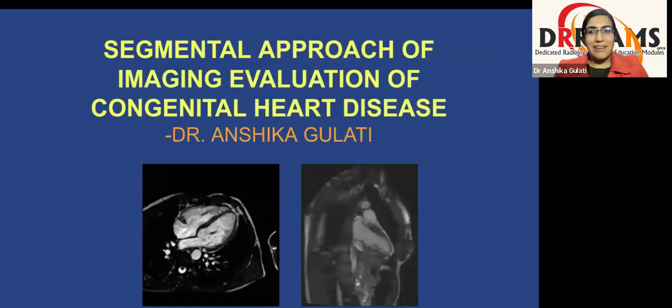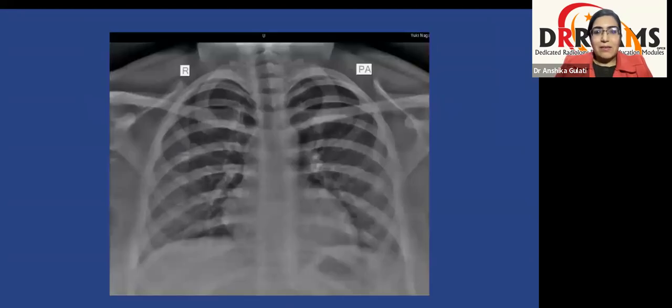Everyone, and today we are discussing a very interesting topic, that is the segmental approach of imaging evaluation of congenital heart disease. So let's get started. The first investigation is always a frontal chest radiograph, so we'll start with that.